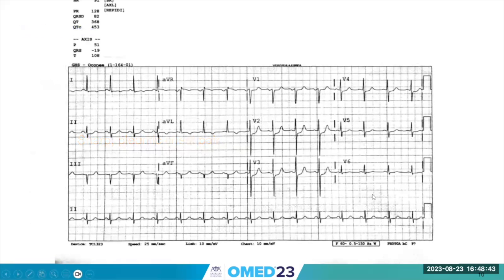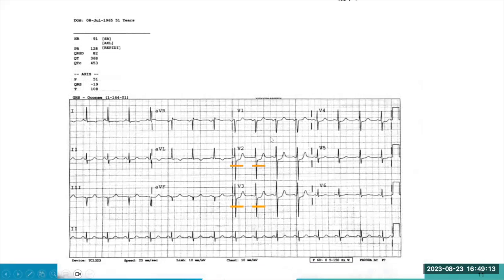Now, moving forward on to our next EKG, take a look at this one. So rate, rhythm, axis, we have a little bit of left axis deviation, but I'm going straight to the ST changes, okay? So I don't necessarily see any ST elevation in the limb leads or the precordial leads, but I do see some ST depression here in V2 and V3, okay? And I do see some flipped Ts in 1 and AVL. And we'll point these out on this EKG here.